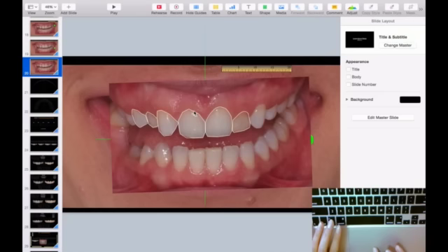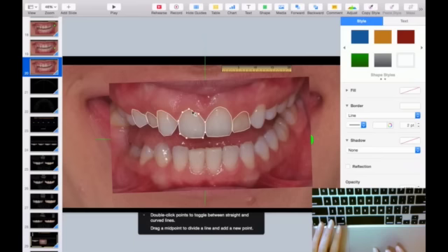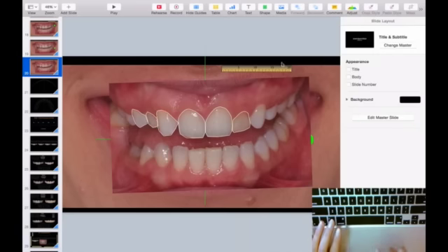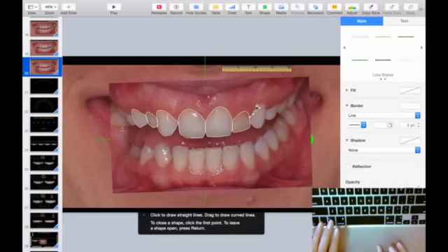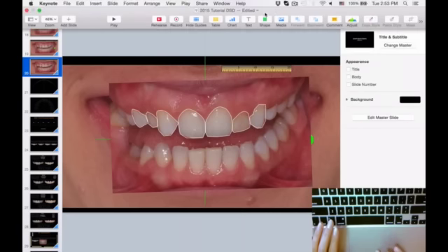If you're going to show the patient, I recommend you do this and make the lines nicer and smoother. Because it's better to show them something that is exact, otherwise they're going to say, oh, but he made the picture worse on purpose, so it looks like there's more that has to be done. So try to do this as best as you can. This is great for the understanding of the patients of all the difference that it's going to be once you're done.